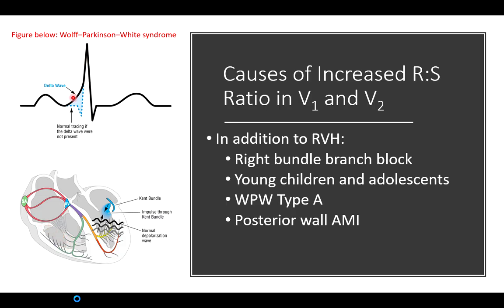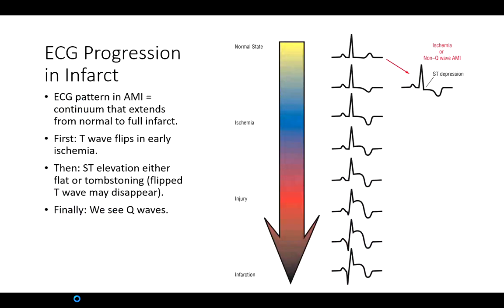And the problem here is, sometimes we can mistake this for some type of left bundle branch block, but again, we need to be conscious and conscientious that we need to look for other signs and symptoms and other indicators of what's going on. Type C is really rare. Typically, the QRS is upright in V1 through 4 and negative in V5 and 6, just as an example. But typically type C Wolff-Parkinson-White is not as common.